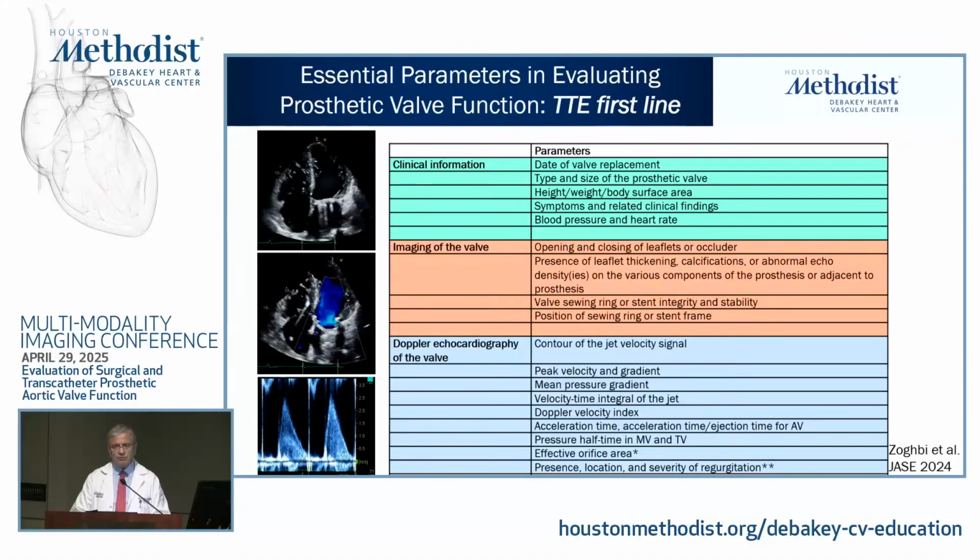Best is in the mitral position, I would say 100%, and it is reduced in particular in pulmonic valve position. In aortic, you're on the side as opposed to an en face view, so there may be some dropout. Tricuspid, best in transthoracic because it's closest to it, but also in esophageal, it has its own views because of shadowing of the structures before it, which is the aortic valve and other structures of the heart.